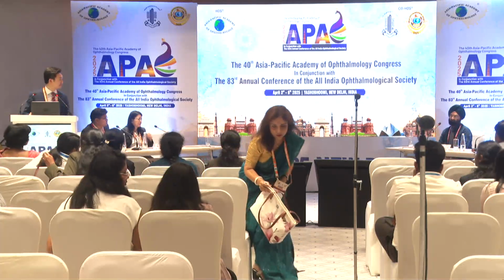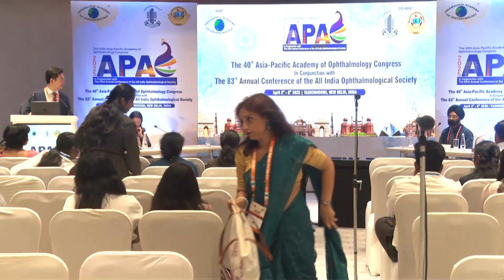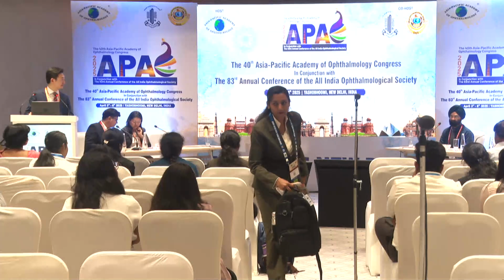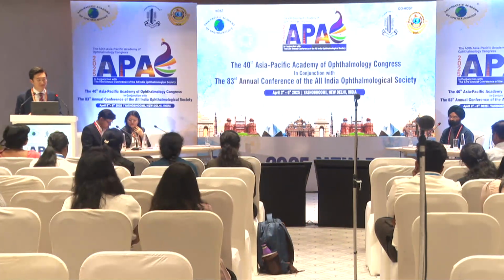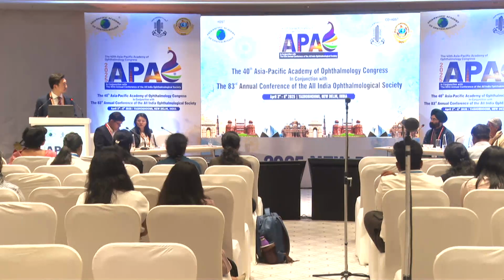Doctor, how about the exact determining of the scleral spur, because I think that's the main point. So how are you sure that you've been able to go on to the scleral spur?